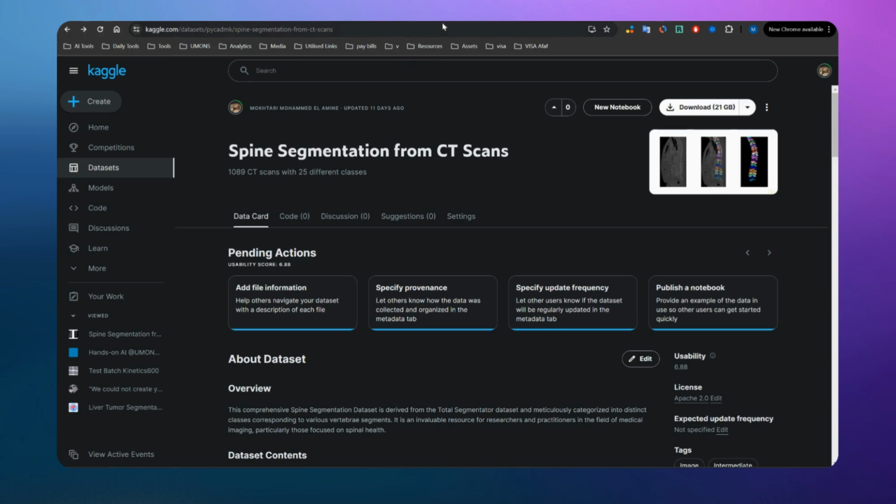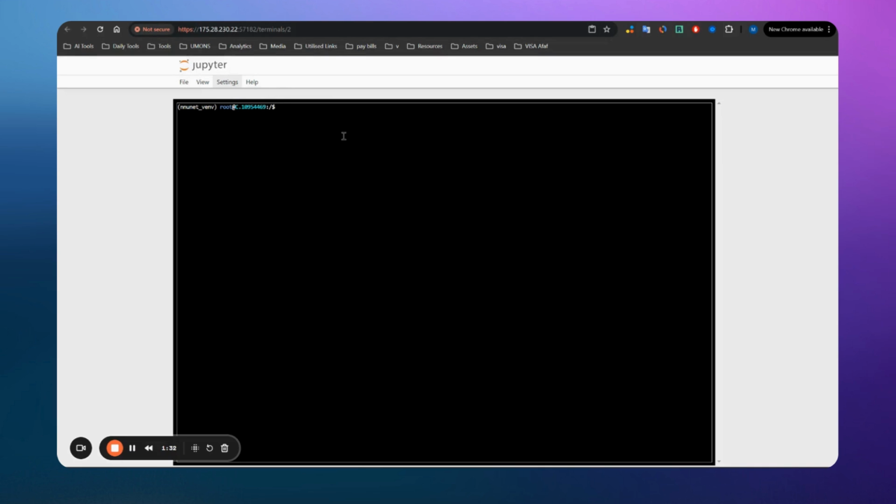So yeah, this is the dataset, but I will show you how I download it from my Dropbox, so that it will be easy. But if you prefer downloading it from Kaggle, then you can go and do that. Or for sure, if you are using your own dataset and not my dataset, then you need to see how to get it accessible in your workspace, which is either here in Vast AI or on your own server. Okay, so here I will just download the dataset.